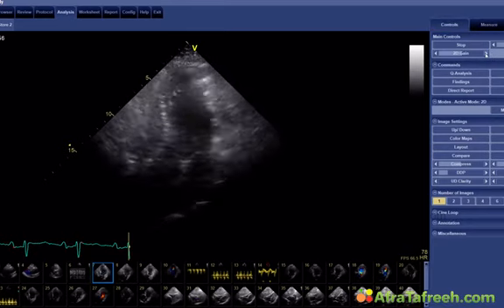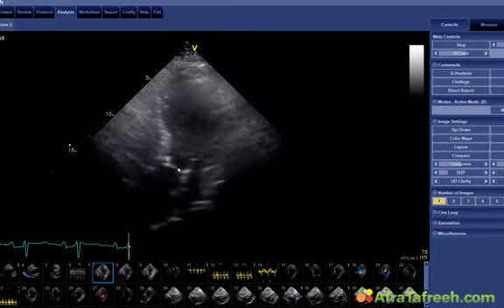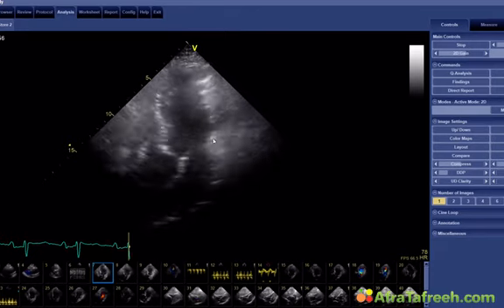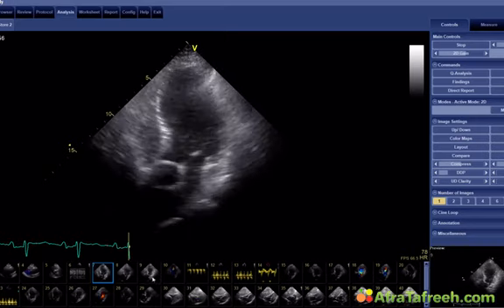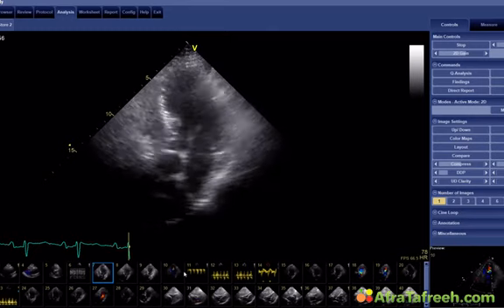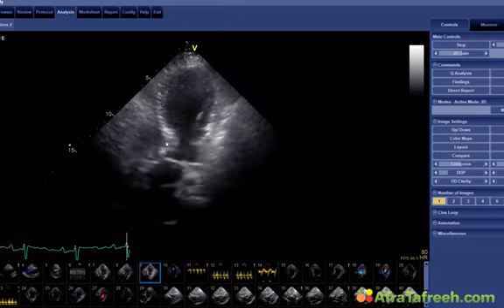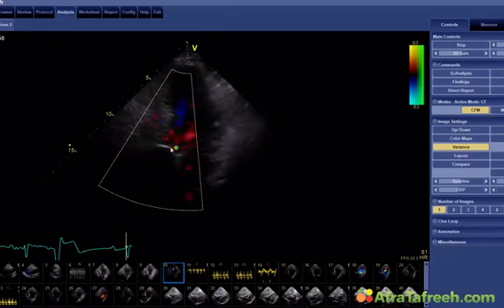Well, maybe it's the left ventricle. This is a 4-chamber view. Now, the patient was very difficult to image, actually, and those were the best images we could get. But still, I guess most of you will appreciate that left ventricular function is rather normal here. But, so the ventricle, could it explain his dyspnea? Well, we'll find out. Another image of the aortic valve, which is a bit thickened. Here is the aortic regurgitation.